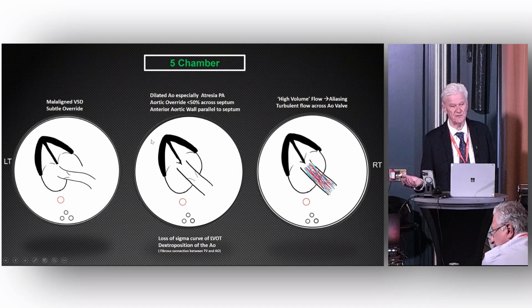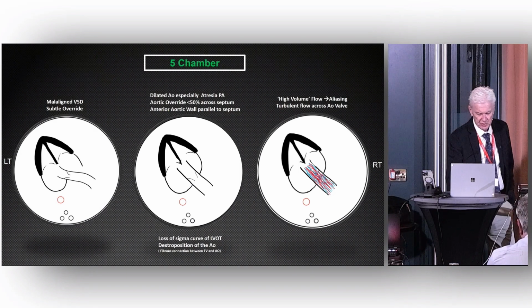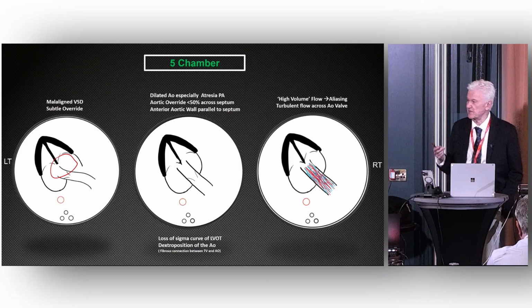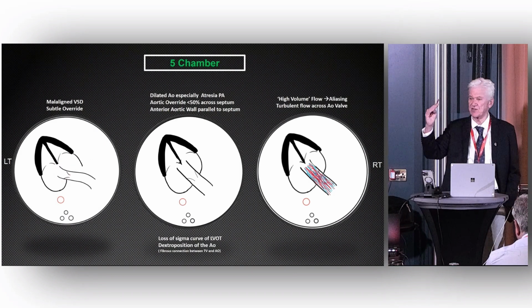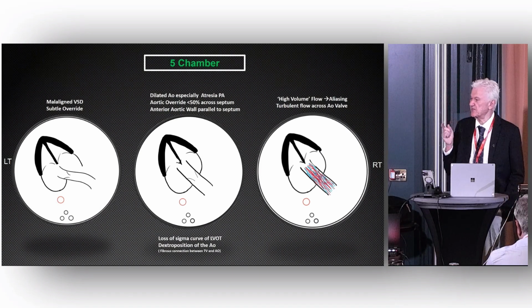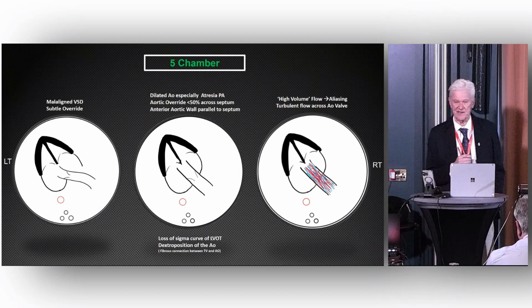So it comes really to the 5-chamber view, where we make the diagnosis for most of these. If you go to work tomorrow morning and you see a perimembranous VSD, of course, the first thing that comes to your mind is you say, I wonder, is this a Tetralogy of Fallot? And what you do is you look at those 5 sections I mentioned about the LVOT, and you ask yourself the question, if it is discontinuous, is it actually malaligned or is it aligned?